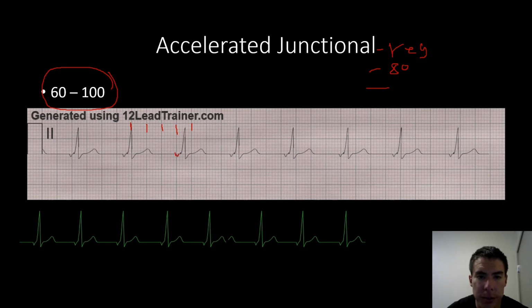So this rhythm doesn't appear to have any Q waves, so those are actually just inverted P waves, because we have that same notch and then a little bit of an area right there and right there. So that tells us that these are P waves and not Q waves, because it shouldn't come back up and flatten down, even though it's very short.